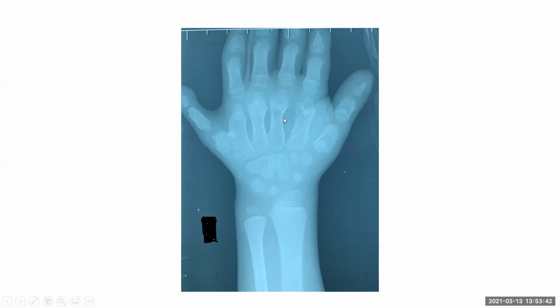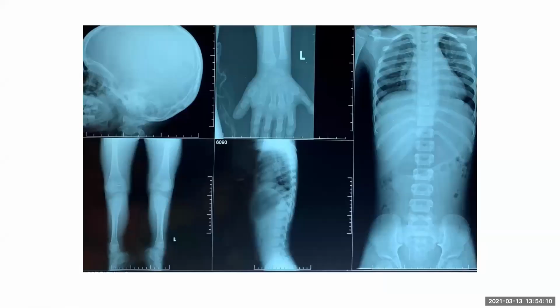You're very right. These metacarpals are short and stubby. There is fusion of the supernumerary. This is a post-axial extra digit, right? This is on the ulnar side, and there's fusion of it and the fifth metacarpal. The capitate and hamate are also fused. What would we do next in clinical practice? Think of a syndrome, do the skeletal survey. Yes. And so this patient had this hypoplastic tibial epiphysis.